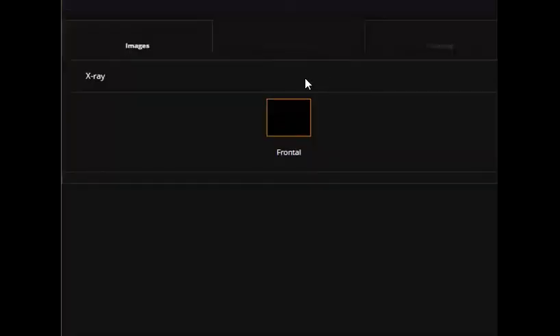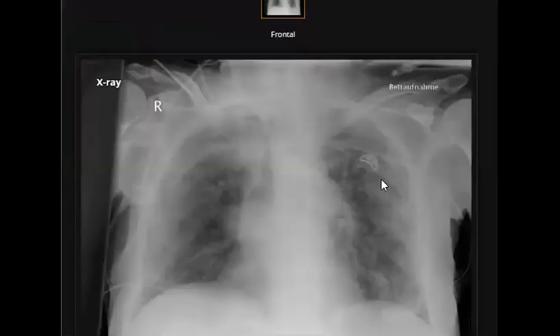Let's show this one. Where do you see this? This is the venous type. Just to be familiar with this appearance, maybe you can see some endotracheal or tracheostomy tube, some central venous lines. But this is what is called ECMO, and they like to put it in the venous side like this, veno-venous.